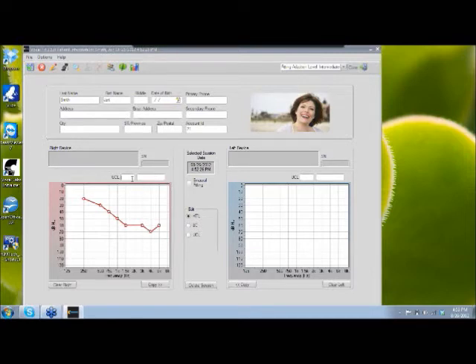One thing that's also very important is to put a UCL number in here, because that will be taken into consideration when doing an auto fit. It will adjust the compression ratios and thresholds accordingly to never allow the output to go above this number that you put in here. So that's very important. Frequency-specific UCLs, you can put them in for your own reference, but it does not take them into consideration when doing the auto fit. This number right here is what's important.